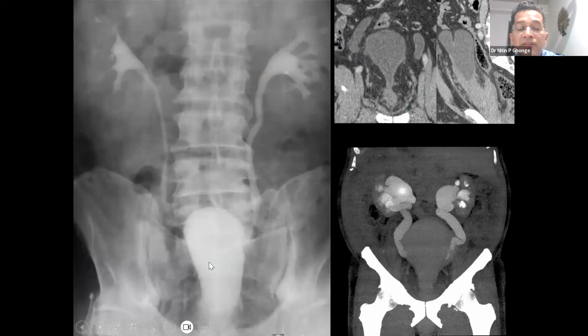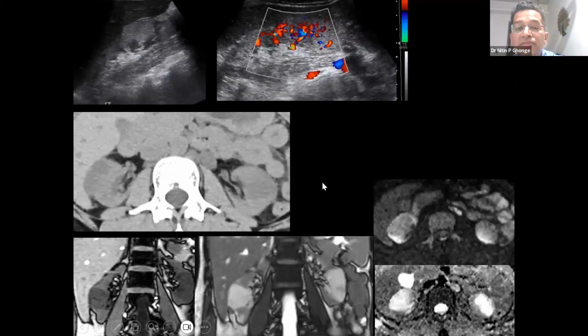This is another example of an elongated pear-shaped urinary bladder. You can see the abnormal inflamed fat. This is pelvic fibrolipomatosis and causing a lot of proximal dilatation and obstruction in the kidneys on both sides.